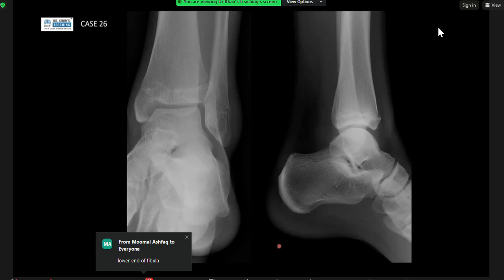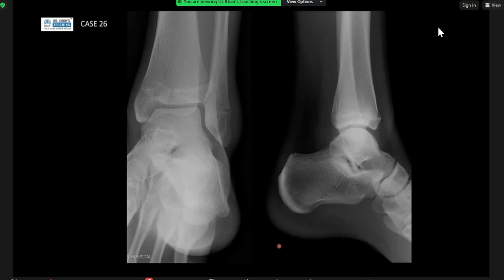So painful swollen ankle. There is some soft tissue swelling around the ankle joint. I think just to make a point when you're reporting pediatric films, take a close look, drawing all the contours. Any lucencies, you should be able to define. And if you can't, look at Keats first to make sure it's not a normal variant. And then after that, you can explore the other differentials.